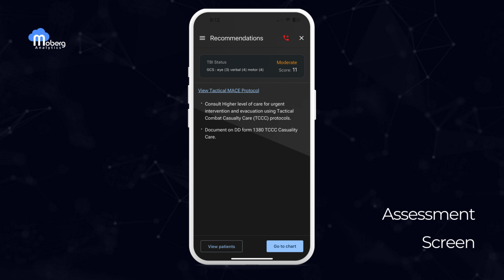At the top of the recommendation screen, you'll see the GCS score, along with a breakdown of the score by eye, verbal, and motor responses. Below that, the app displays recommendations generated based on T-MACE guidelines, offering guidance on the next steps for patient care. From here, you can either go to the chart page or return to the home screen to view all patients.